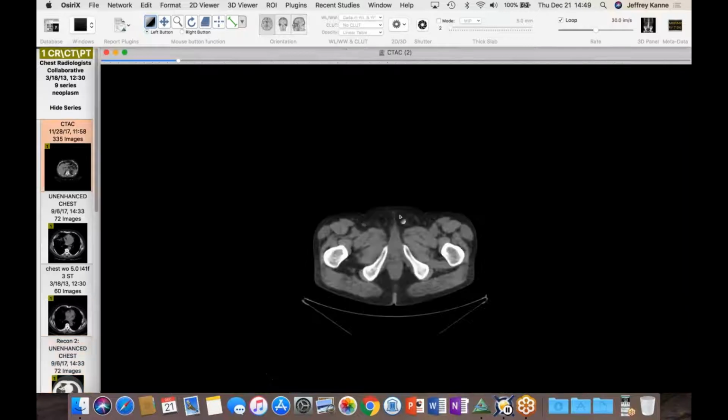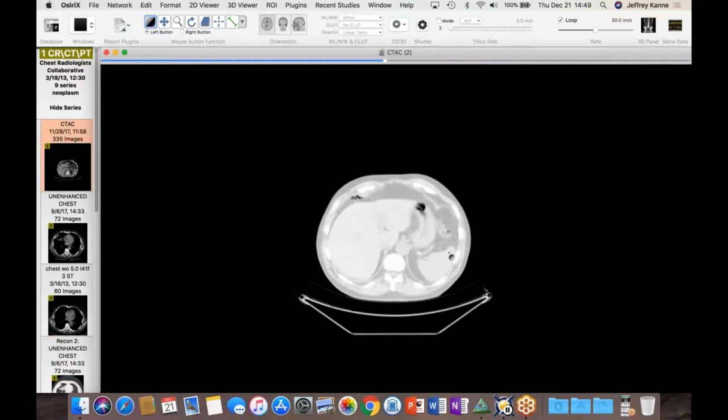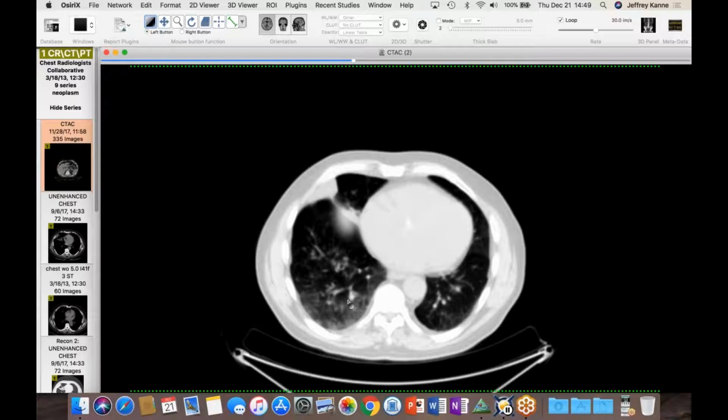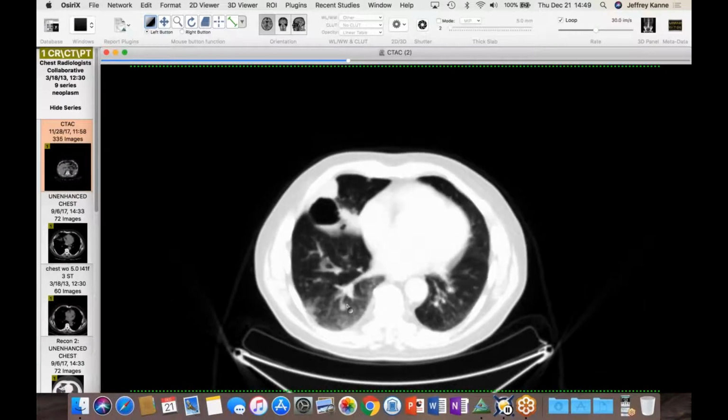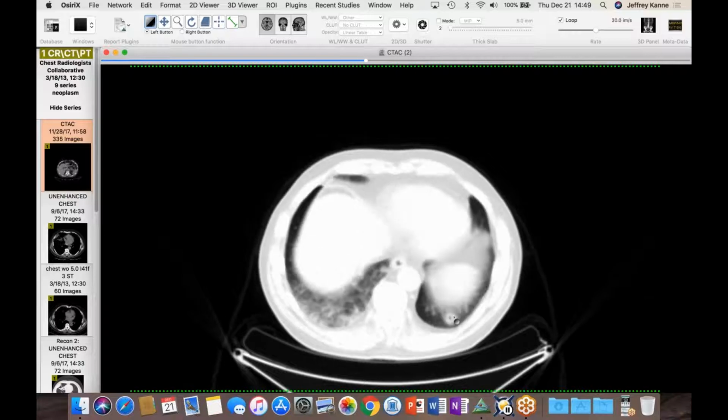But there's another, later CT. This is from the PET, but those nodules were there on the PET too. And you can see some of them have little cysts in them, the little Cheerios. Some are more solid, and they're in both lungs. You can see that kind of looks like your case there, just at a poor spatial resolution.